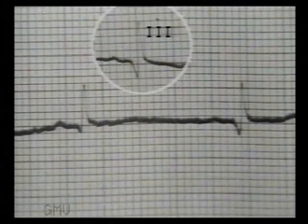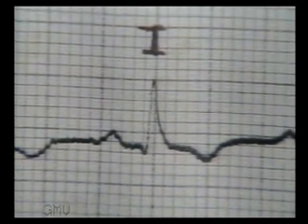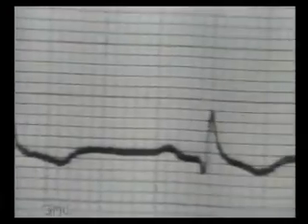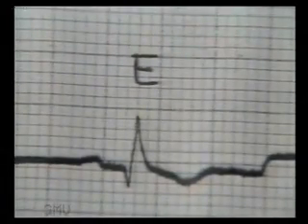So if Q wave is seen only in lead 3, take a tracing in deep inspiration. Now see another tracing. No Q wave in inspiration marked I, and note the appearance of Q wave during expiration.